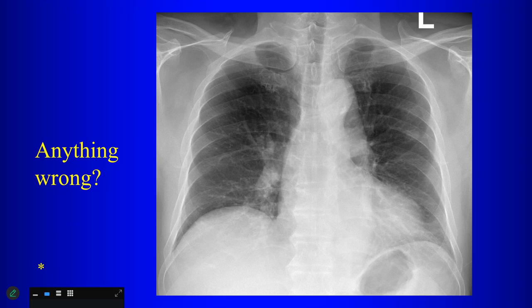Nothing? All right, so you're a little bit looking at that. Anything else? It looks like the descending aorta is a bit distended. There's a tortuosity of the descending aorta. That worth calling a referring physician about? Not really. Anything else?